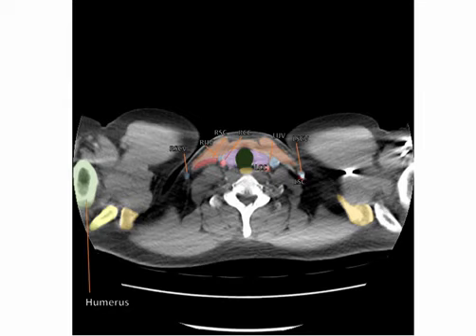This is bounded by the T1 vertebrae, the first pair of ribs and their costal cartilages, and the manubrium of the sternum. A run-through of the same CT scan which we have examined will follow this presentation. You can use this to test yourself.